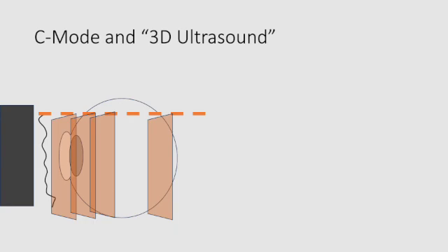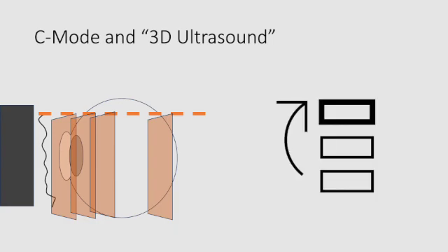Basically, you're just taking one beam, and then you're taking B modes across that beam by changing the angle of the transducer to get a pseudo 3D image. Really not a lot of medical applications in point of care ultrasound right now, but if that changes in the future, we'll go into this in more detail. It just stacks all of them up to create an image.